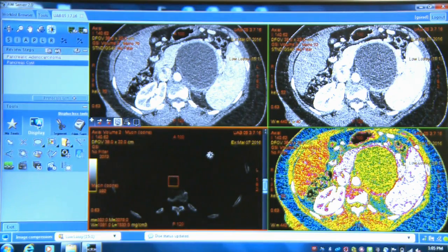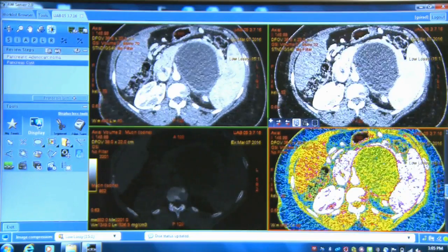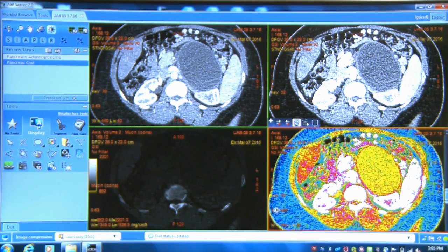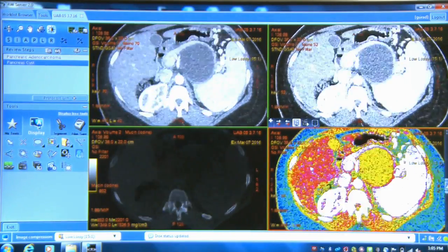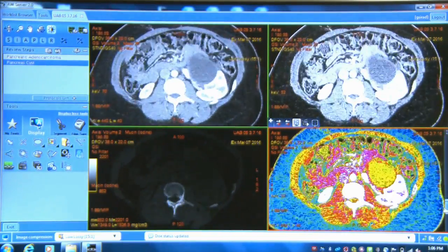So we get it where you can see the cyst. When I put a region of interest in here, I get something that's in milligrams per cc mucin. But I just want to show this, which is the 52 keV with the French filter that's just a color filter. I'm going to make this a bit thicker by just clicking on the slice thickness so there's less noise. Basically, we can look in and around, whether we're looking at the virtual monoenergetic images, the mucin image, or this filtered image, and there's nothing in there that looks solid.